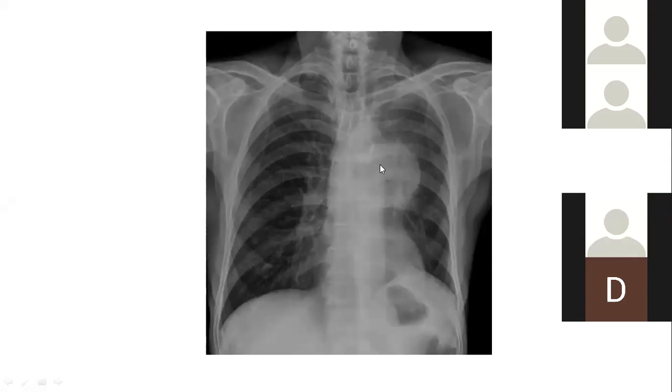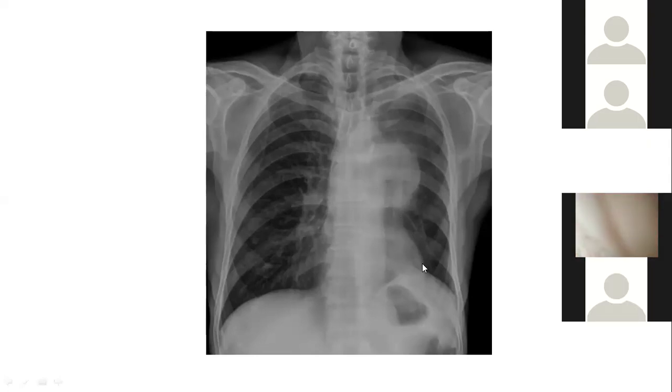And if it is in the mediastinum, how do we localize where exactly it is located? Now, yes, we can see certain vessels here, right? And you can see the margin of the heart. So someone has written hilum overlay. One of you has written hilum overlay sign. So what exactly is a hilum overlay sign?